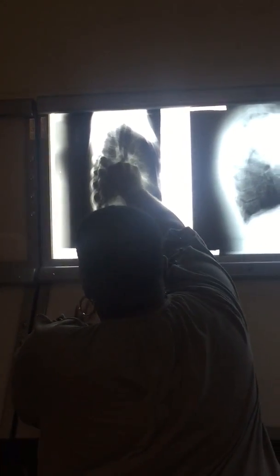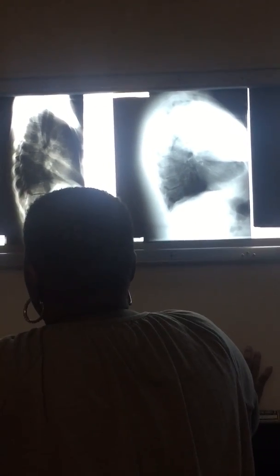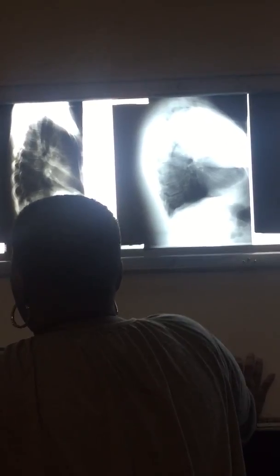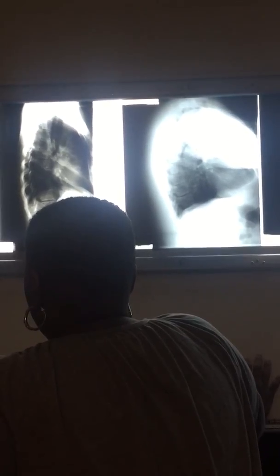The other thing that you'll need to identify will be the intervertebral foramen. Those are the little circles. That's the main thing that they're looking at on this radiograph is the intervertebral foramen. So make sure you be able to see that and identify those. You don't have to know which one, but you definitely need to know that they are intervertebral foramen. Make sure you don't get that mixed up. Some people got that mixed up on the last test.